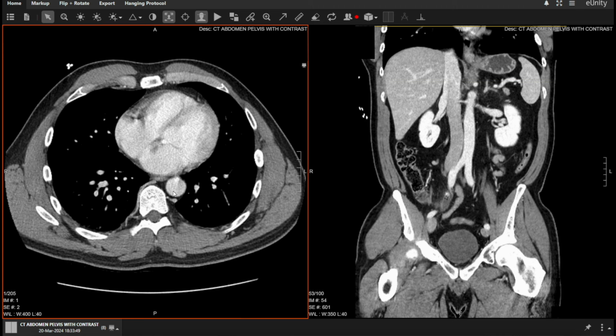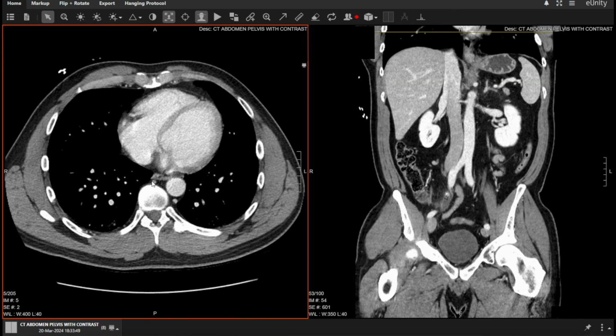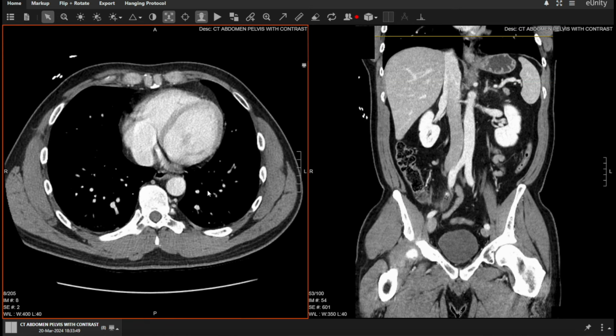Here you can see the aorta, and there's a large vein that comes off of the central chest here called the azygos vein as well that you can see. Now I'm going to scroll down and note that we're looking here at the heart. The heart will line up with the right ventricle pressed up against the sternum, so you always can look at this big area here and know you are at the right ventricle, which makes this the left ventricle, this the left atrium, and this the right atrium.